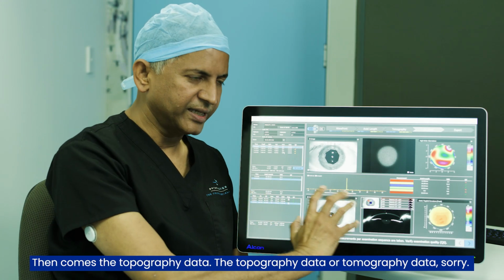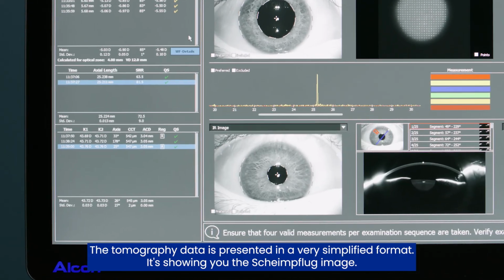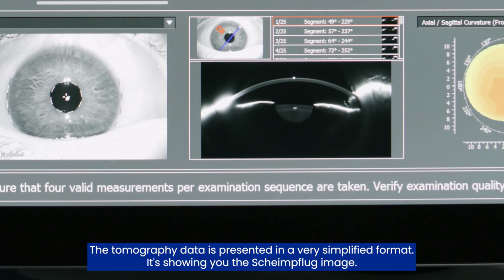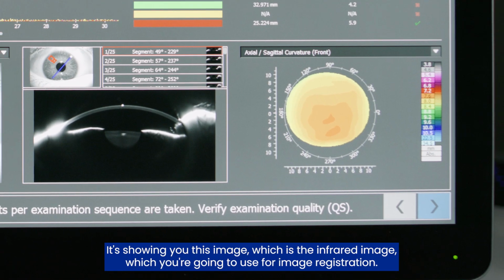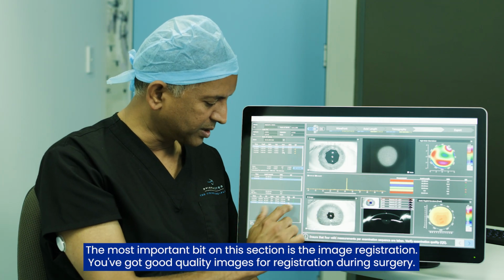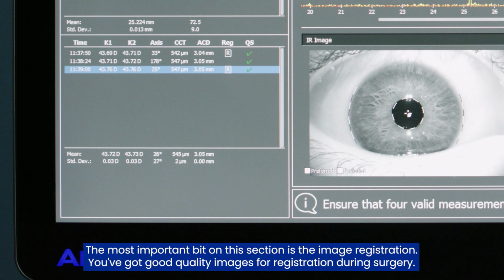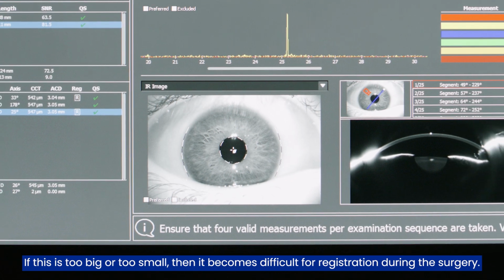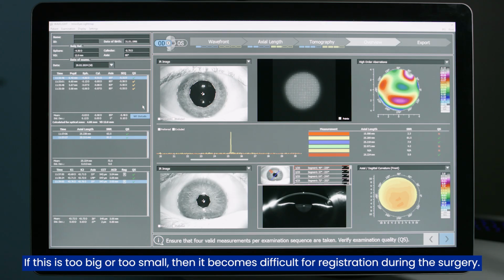Then comes the topography data. The tomography data is presented in a very simplified format. It's showing you the Scheimpflug image. It's showing you this image, which is the infrared image which you're going to use for image registration. The most important bit in this section is the image registration. You want good quality images for registration during surgery. If this is too big or too small, then it becomes difficult for registration during the surgery.